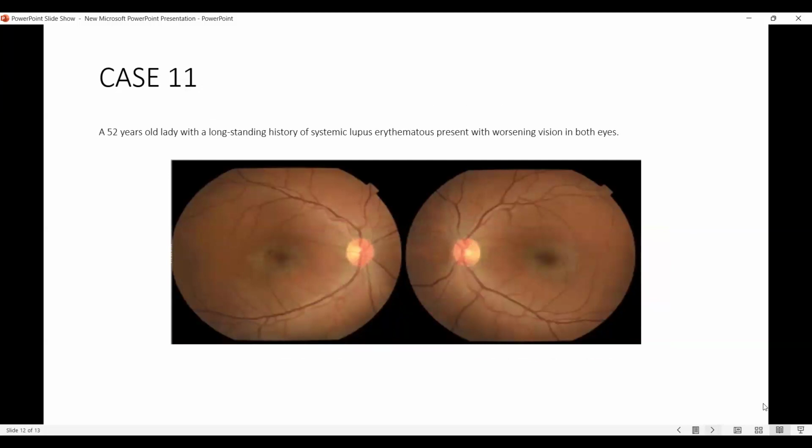Okay, I'm Dr. Charlene. So these are fundus photos of both the left and the right eye, both showing a hypopigmented ring around the fovea that is slightly granular in pattern, with some pigmentary changes temporal to the fovea in the left eye, giving a bullseye appearance. The disc appears to be round with clear margins, and the vessels are of normal caliber. The rest of the retina appears to be healthy.